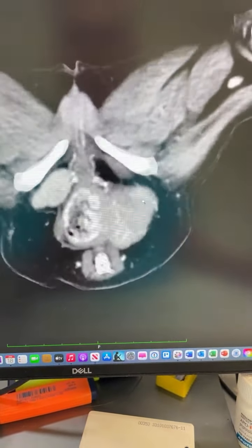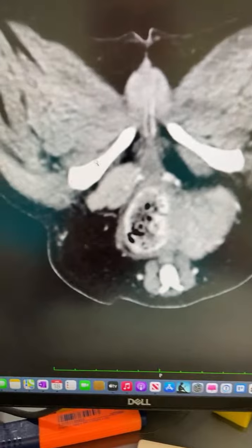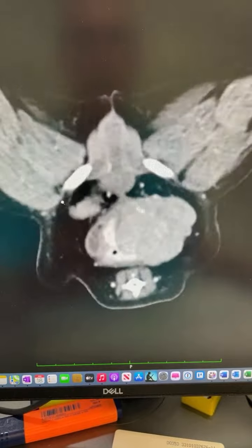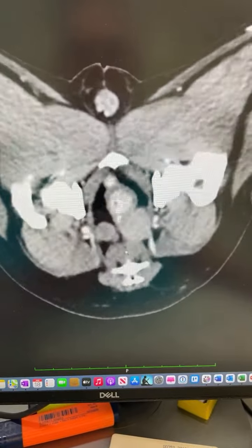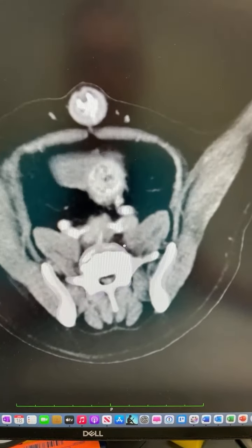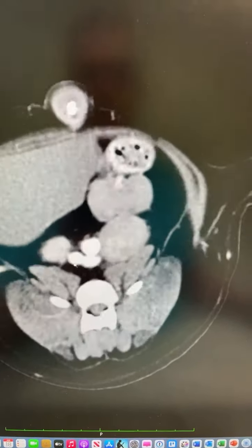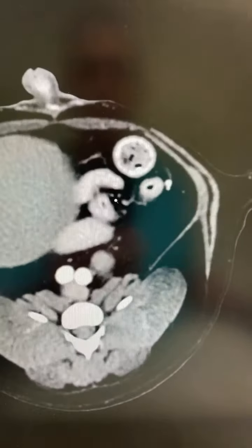Now this dog, looking at the abdominal CT scan, we can see here this huge primary anal sac tumor, and then as we head cranially, we see a lymph node that's sitting right here on the pelvic floor. And then as we head farther cranially, we can see another lymph node that's here in the pelvic canal, and many more lymph nodes up here that are dorsal to the rectum and consistent with metastases. These are more lymph nodes up here that are medial iliac lymph nodes, and there are even lymph nodes that are climbing up along the lymphatic chain, which would be attached to the colon.